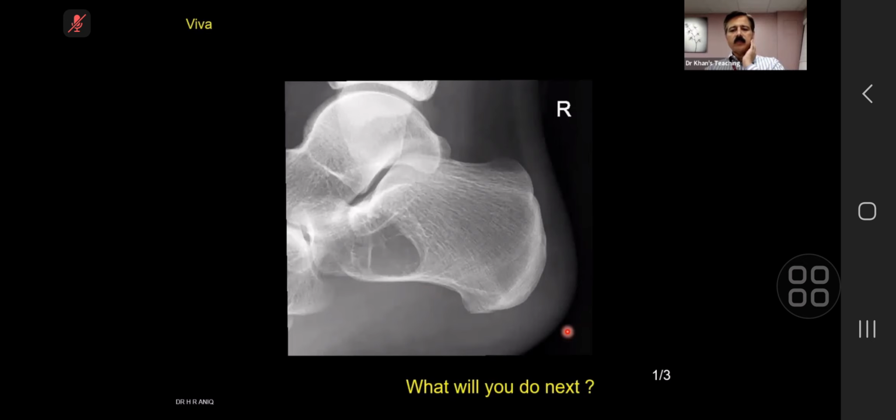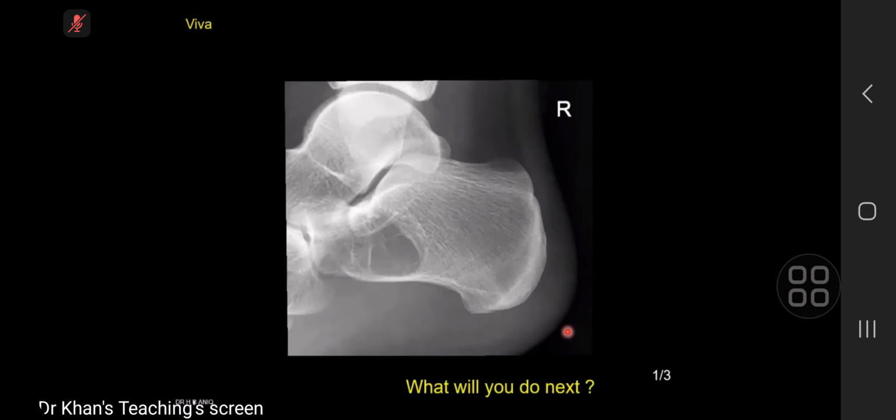Can you take this as a film? The lateral radiograph of a right calcaneus of a skeletally mature patient. There's a well-defined lytic lesion in the anterior part of the bone. I stop you because of time factor. What will you do next? So it looks benign. My primary differential is between a calcaneal lipoma or a simple bone cyst. If there are some small calcifications within, which favors lipoma, but if I wish to prove it, a CT could demonstrate the density of the lesion.